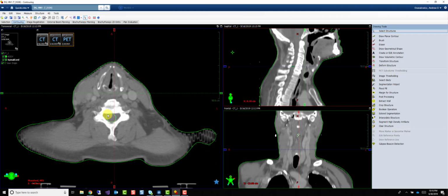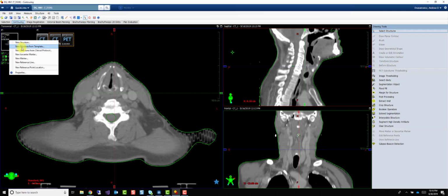You can see now it changed. It's only the outline, it's only the contour, it's not filled in. So you pick your type of color just based on what you want to see and whatever's easiest for you to visualize.